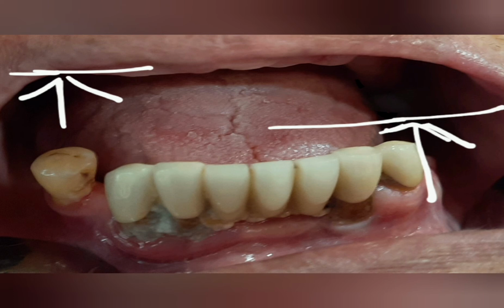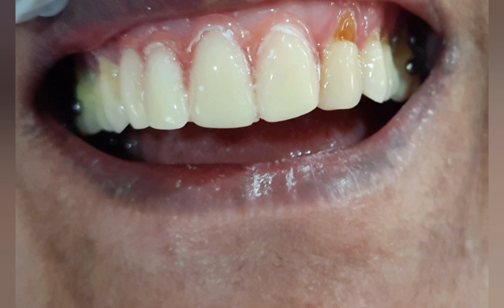In such ridge deformities, extensions, protuberances, etc., where pre-prosthetic surgery could not be planned due to various reasons, we need to modify the rim according to the patient's planned reference planes. And while articulating and setting, the teeth have to be sufficiently trimmed. After the articulation is done perfectly, the anterior teeth have to be set along the outer periphery of the occlusal rim. As you know, the tip of the incisal pin should just touch the midline drawn on the occlusal rim.